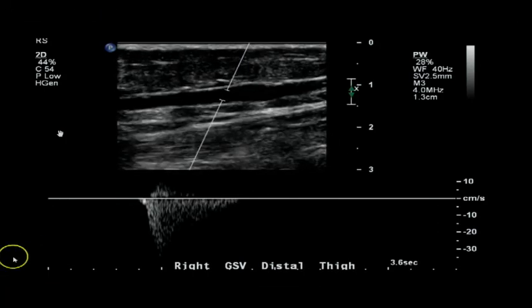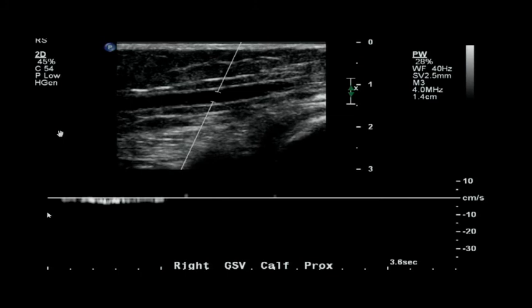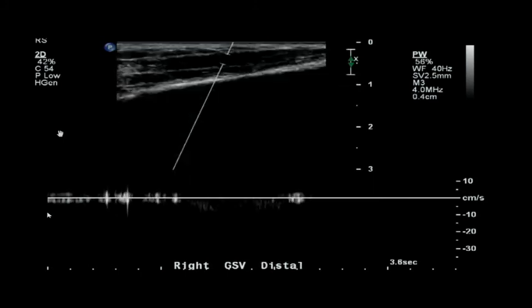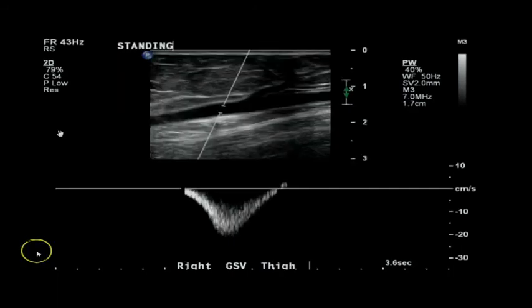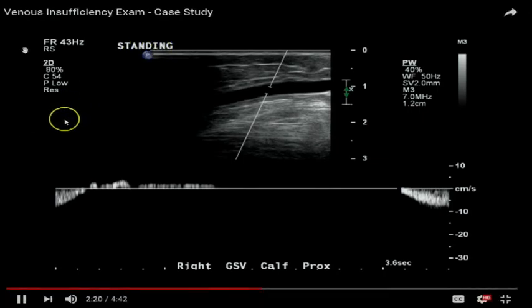And you know that specifically because it's matched, right? Yes, because it's got a match below. It's mirror image. However, having looked through the entire study, you should notice that the sonographer performed provocative maneuvers, both lying down and standing. Therefore, the images here in the proximal calf, mid, and distal calf, which all appear to be completely normal, are negated by showing the Doppler signal, at least in the calf, with the patient standing, as you can see here.